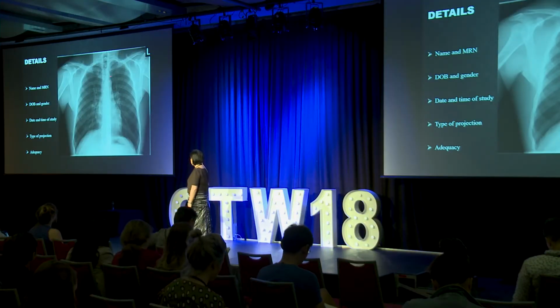And then after you check all that, apart from adequacy and the area, you also want to make sure the exposure is correct. Even in a well-exposed film, you're supposed to be able to see the spinous processes, especially at the mid-thoracic level.